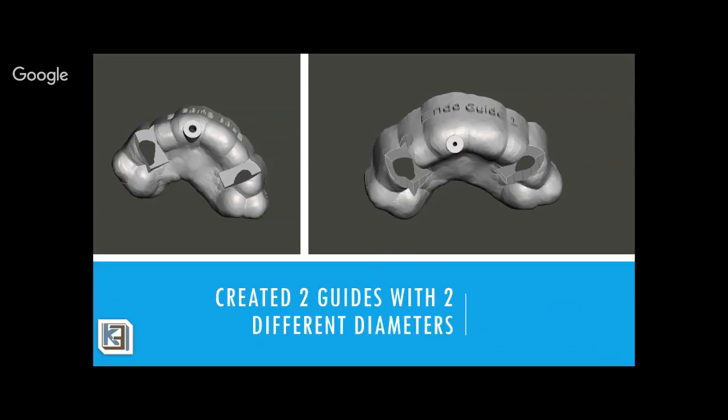True that, yes. So the Blue Sky Plan is an amazing software, and it is available for free to download. And you can view DICOMs on it. You can play with it all you want. The only time the software or Blue Sky charges for anything is when you export an STL file out of the software, which is the file needed to print on a 3D printer, and that's the only time you get charged by the software. And Blue Sky Bio has been very gracious about this.